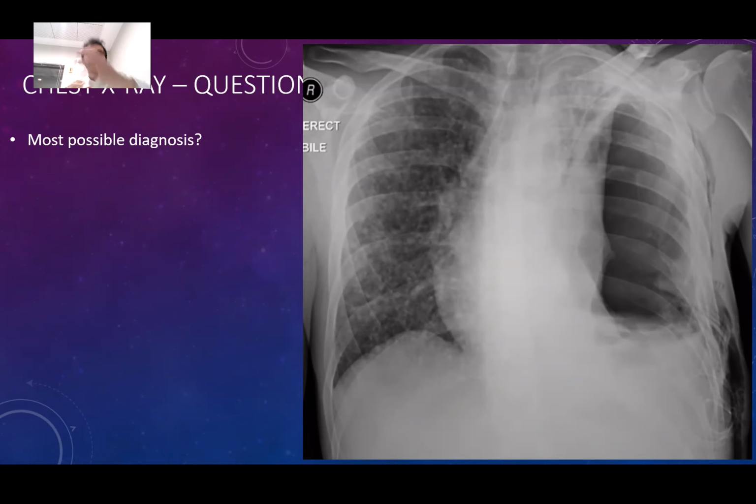Let's say I'm the student. I started going from outwards to inside, from the most lateral pieces. Humeral heads are fine. Clavicles are good. I'm looking at the soft tissues. I cannot see the neck. The axillas are good, by the way. I started finding some pathology, free air in the soft tissues of the right lung, left lung, I'm sorry. Okay, this is a good start. Then I looked at the costophrenic angles, which are open here and blunt here, right? I'm seeing a fluid level, so there's definitely effusion on the left side.